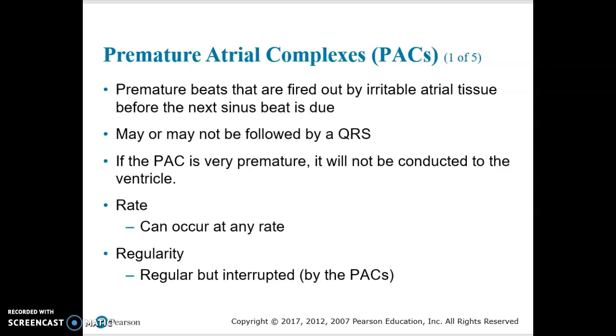Chapter 8, Video 3. In this video, we're going to talk about a premature atrial complex, also known as a PAC. PACs are premature beats that are fired out by the irritable atrial tissue before the next sinus beat is due. The sinus beat has fired away and it's going down the pathway, but with a PAC, that atrial tissue just spits out another irritable beat.